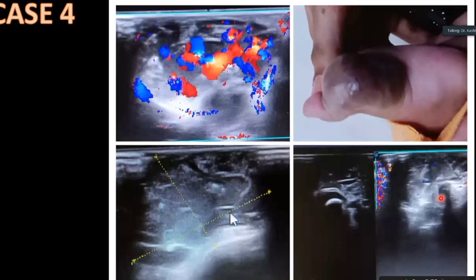Venous malformation, not hemangioma. Okay, phleboliths in childhood mean venous malformation. Phleboliths in an adult patient usually represent hemangioma.